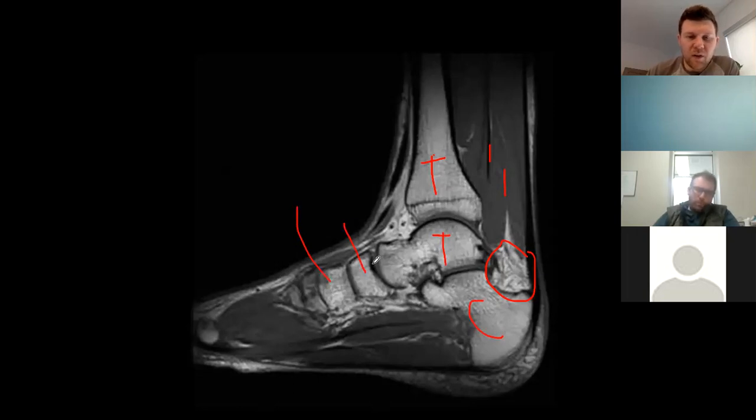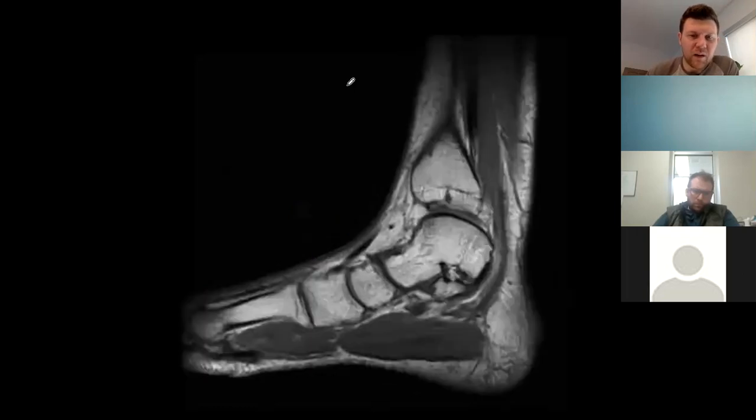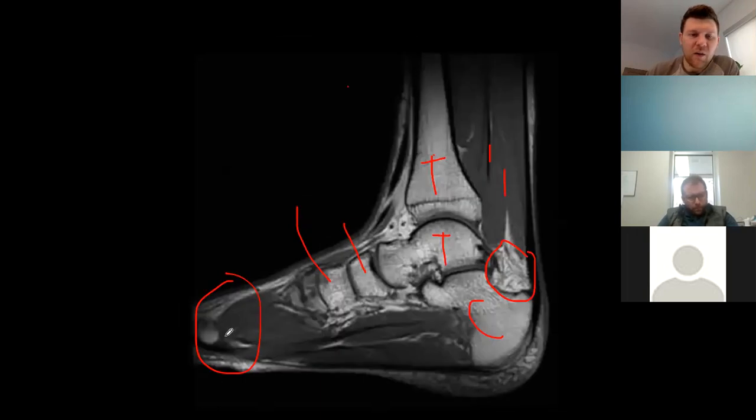What would we look for distally to tell if we're all the way at the medial cuneiform? First met base. Okay, so do we see sesamoids underneath there? Kind of looks like it. Yeah, maybe there is. Sometimes if we have a good slice, you can tell. Here's a sesamoid right here. So if we're not all the way there, then we're okay. You would scroll through normally, but it's probably not the first because there's no sesamoid. So we're probably at the second, which may make that an intermediate, or if it's the third, a lateral cuneiform.